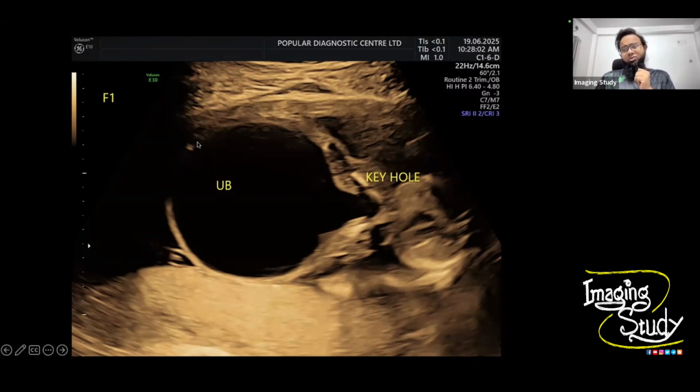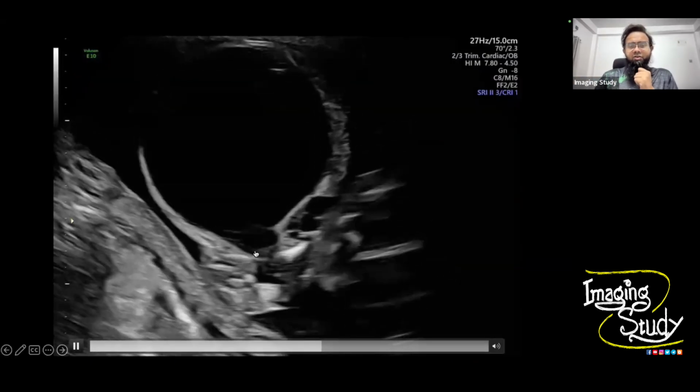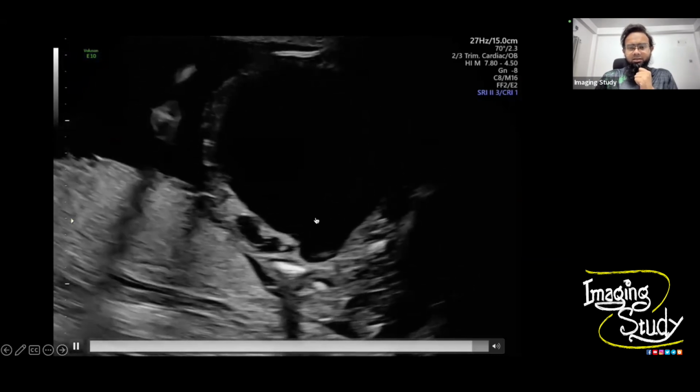Otherwise, you will just destroy the kidneys, and if the bladder gets ruptured, you will see the whole ascites in this patient. So on follow-up, you have to be careful. If you see the bladder is in normal size and the patient is having ascites, you have to understand that the bladder has got ruptured. Okay, so this is the posterior urethral valve in a patient.